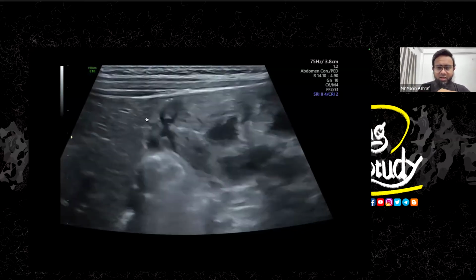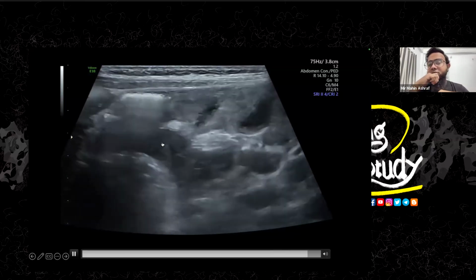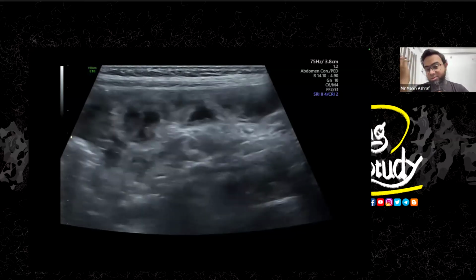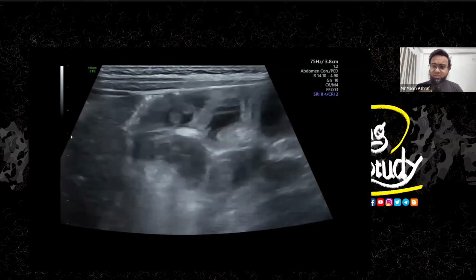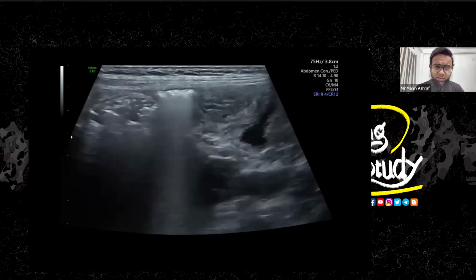So fortunately, we could diagnose these helminths because these are not very common nowadays as the hygiene has got a very good level in our country, and especially where I'm working is a residential city area. So this type of helminthiasis is very uncommon here.